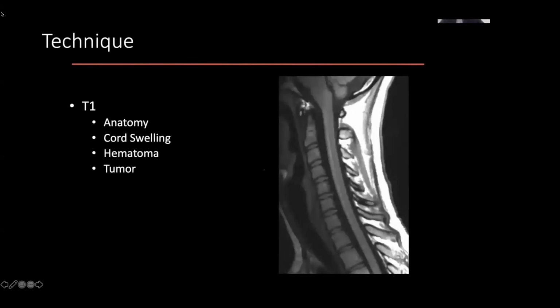But again, just a traditional MRI, T1, you've probably heard of. We pretty much use this because of its ability to show us fat, and you may have heard the term "fat is your friend." So the fat that courses between the various muscle groups, etc., allows us to see structures immediately adjacent to it.